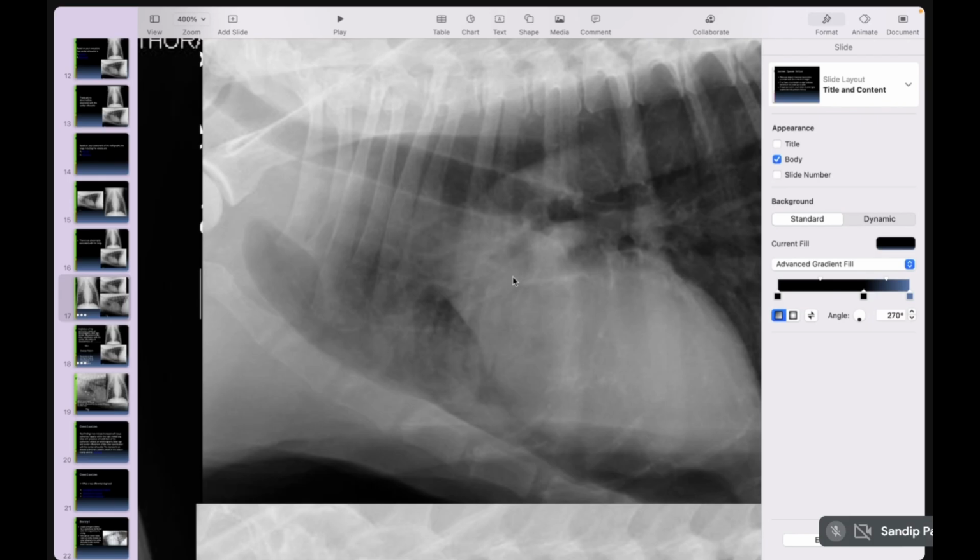Now here, you can see the bronchus, this black all the way up to here, and again here branching, another branch. So now we can see the bronchus, but there is no supporting vessel supply on the wall of the bronchus. So that means it's all white.